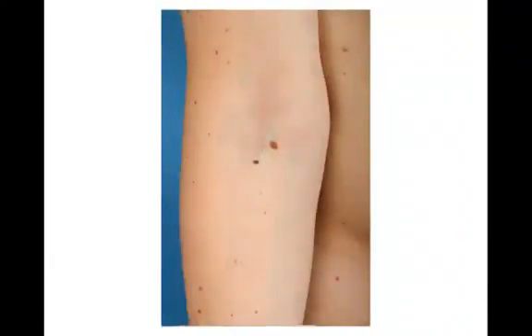Here is another example. Clinically, a very small lesion, only 4 mm. Dermatoscopically, you see a lesion with a chaotic arrangement of patterns and colors, and you see a clue to melanoma. Here at the periphery there are two pseudopods, and pseudopods are a clue to melanoma and should not be present in a nevus, except in Reed's nevus. But in Reed's nevus they are symmetrically arranged around the entire periphery.